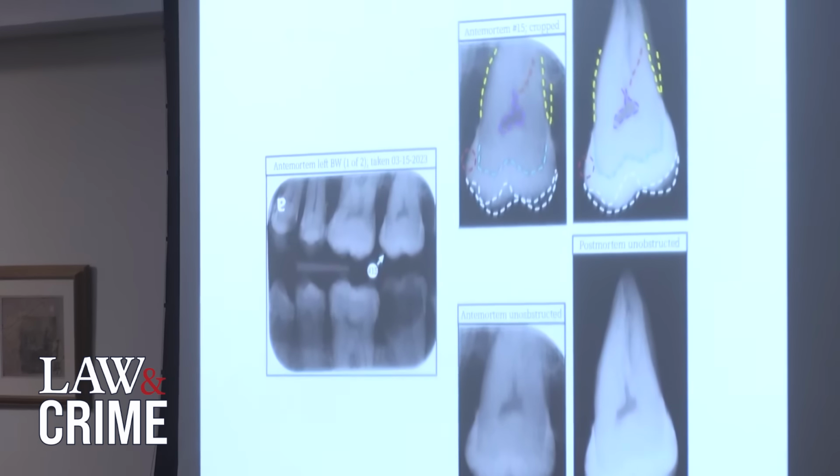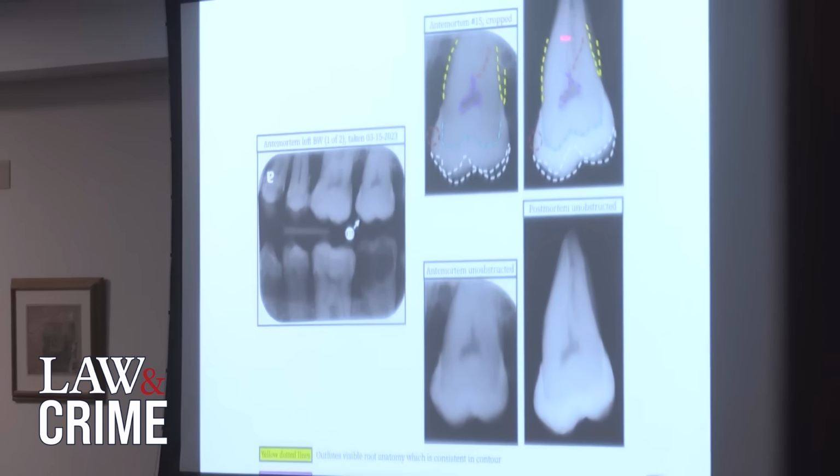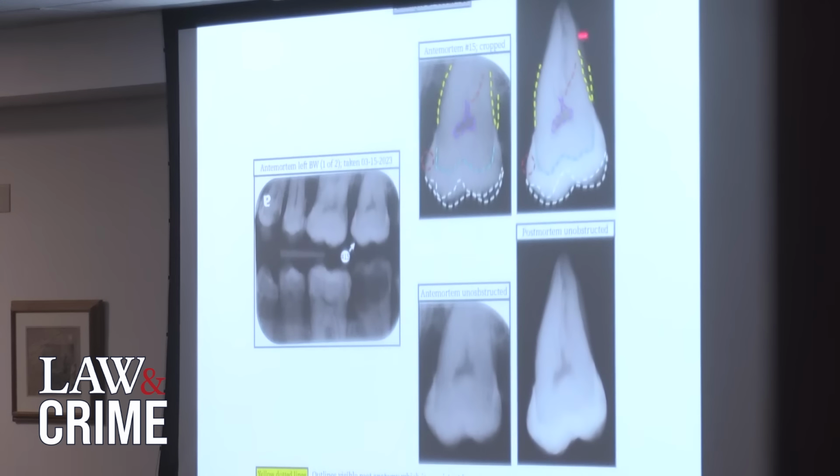So in this bite wing, I just replicated that angle and lined up the anatomy as well. So walking through those dotted lines, the yellow dotted line just shows unique root anatomy that lined up. On this side right here, this details a root concavity. That's what we call it, a little concavity on that side of the root.